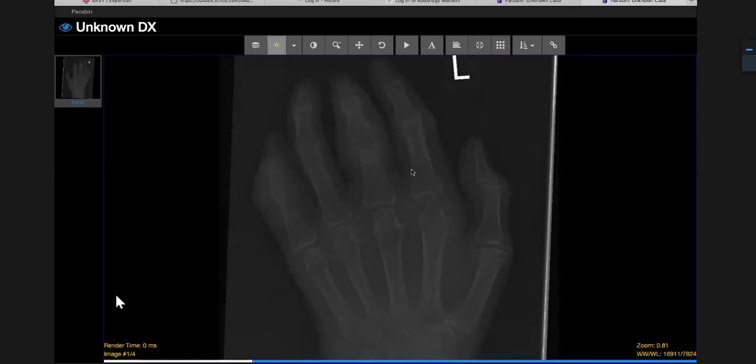North, keep going north. There, yeah, we go. Now just stop around there, I think. Okay, that is where one of the abnormalities is. I know it's blurry for some reason, but go on. You tell me what you think it is.